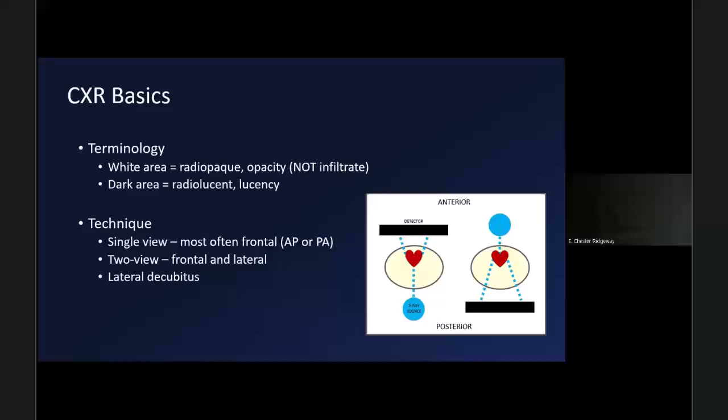So going back to the technique, in addition to this frontal view, you can also get a lateral view. And then in some cases, you can also order a lateral decubitus view. We're not going to go into much in detail about that here, but there are some scenarios where that lateral decubitus view can be helpful.